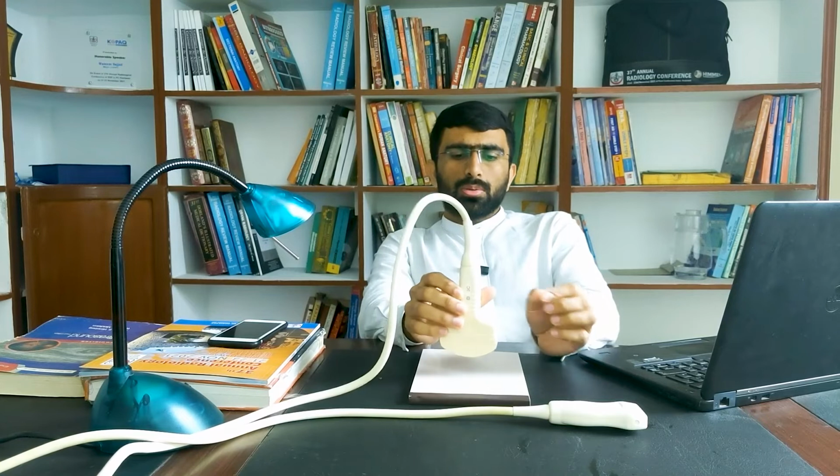The reason is that when we increase the frequency, the wavelength of the ultrasound waves decreases. A decreased wavelength means there is less distance between the crest and the trough of the ultrasound waves, and when this distance decreases, the reflection of the ultrasound waves will be more, which will affect the penetration or transmission of the ultrasound waves. So simply always remember, when we increase the frequency, the resolution increases and the depth of the ultrasound image, or the penetration of the ultrasound waves, decreases.